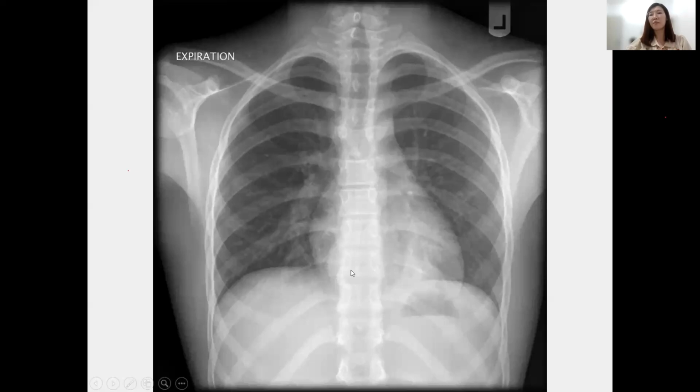That's why I always remember the case, and whenever I have a chance to give a CME, I will always remind everyone to look at the paraspinal line here. Look at the left side, it is nicely delineated, one line, but this one, if we follow, then we see a bulge here. If we do not follow the line one by one, we will miss it, correct? Even sometimes when we purposely look, we may also miss it. So must always remember. This is the paraspinal line opacity, a reminder.